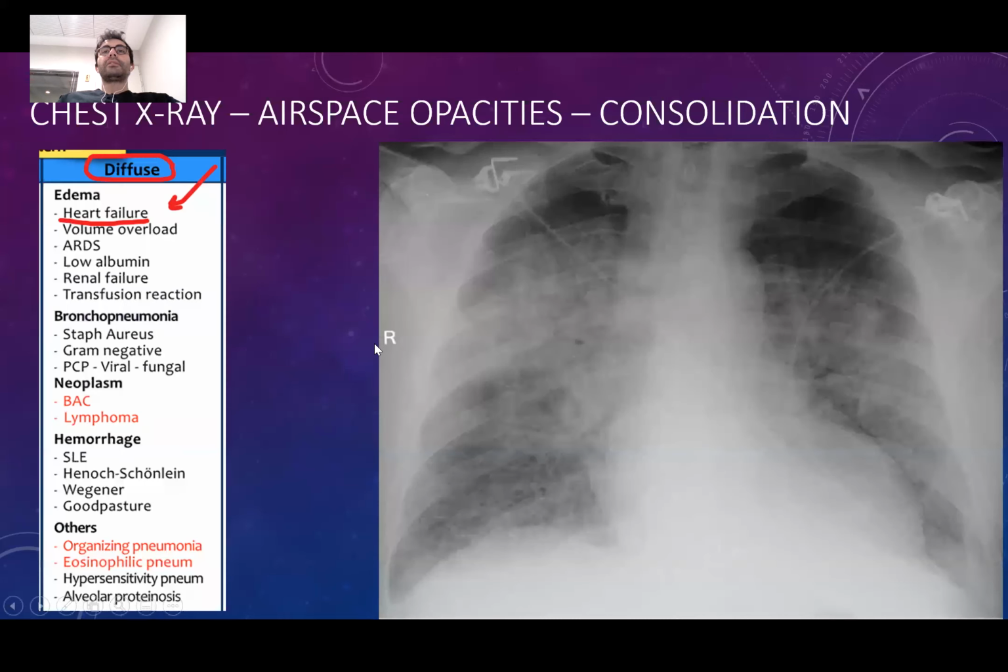Also, when you're seeing a case of heart failure, for example, like this, you should always consider maybe the patient had pneumonia in the right upper lobe first, and then the patient got circulatory insufficiency because of the pneumonia, which happens a lot with old people.